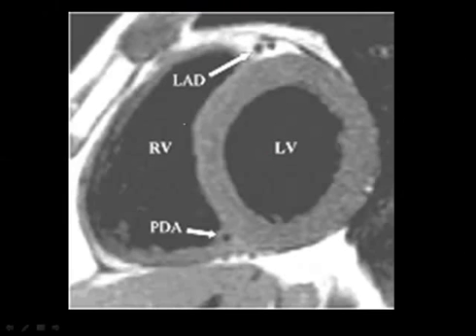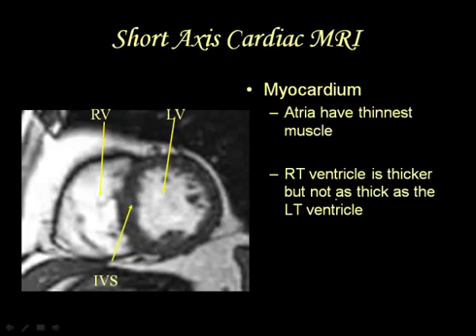Here's another one, and it's outlining some of the blood vessels. So for example, there are the anterior descending arteries and veins. Here's still the septa, and again, it gives you a nice view of the damage, if there is any damage, to the left ventricle. Now here, this is another cine. This is still an MRI. Notice, by the way, that the blood is now looking bright.